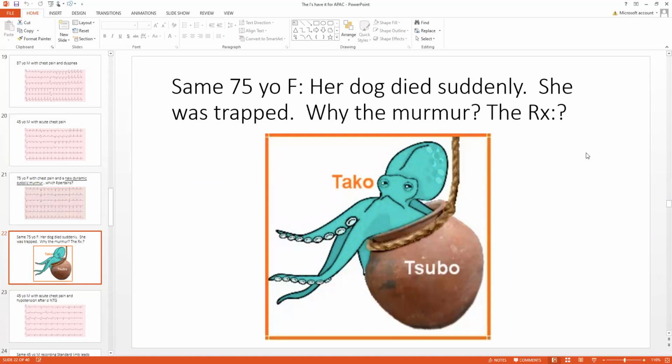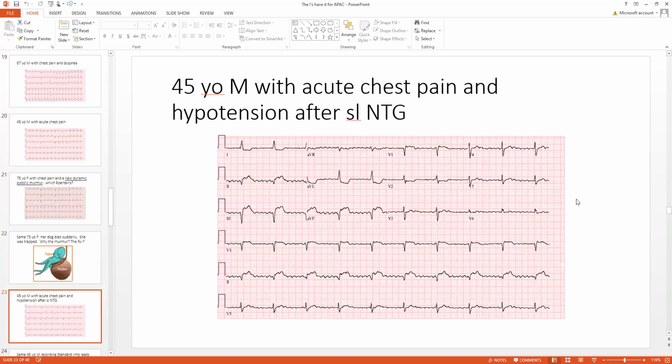There will be troponin, so this is injury. There won't be Q waves if you take care of this properly. And the ventricle will return to normal echocardiographically and symptoms as well within a couple of weeks, in most cases. Takotsubo syndrome.